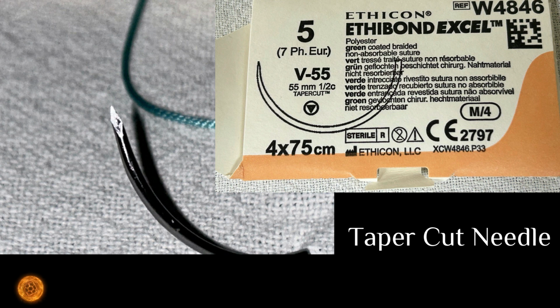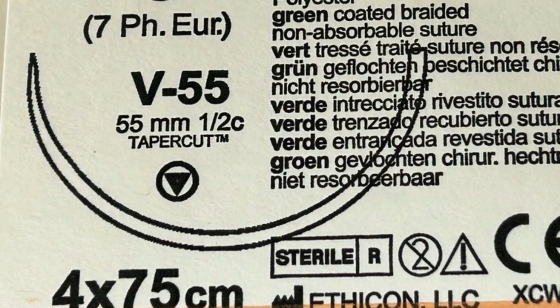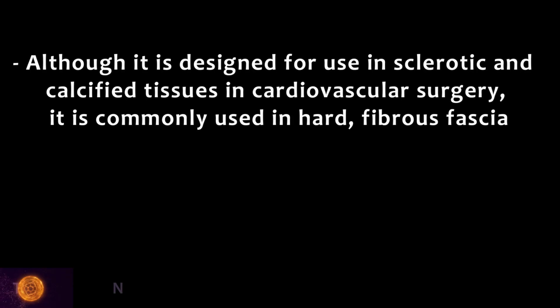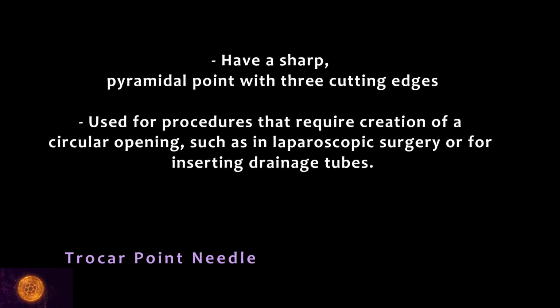This is number 5, and there is a round circle, and in between there is a triangular tip. The taper cut needle is a very versatile needle, friends, and although it is designed for use in sclerotic and calcified tissue in cardiovascular surgery, it is commonly used in hard fibrous fascia, which is difficult to penetrate. It penetrates with ease, and there is no damage because the rest of the shaft is round body.